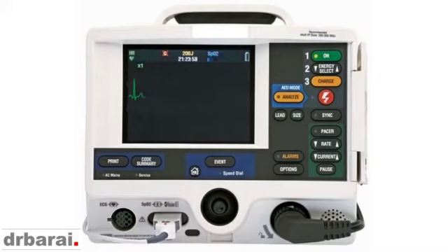Now this is a normal sinus rhythm. Again, look at the patient's pulse and blood pressure. If it is recordable, then we call it a normal sinus rhythm. So there is a P wave followed by a QRS complex. The QRS complex is a narrow complex, followed by another P wave and QRS complex and ST segment and T wave. This is a sinus rhythm and it looks quite normal to me.